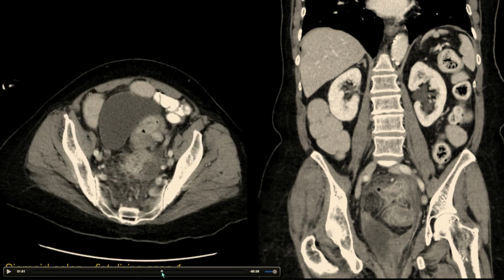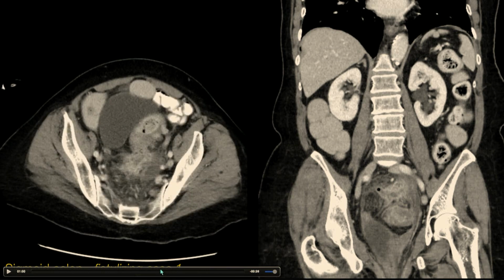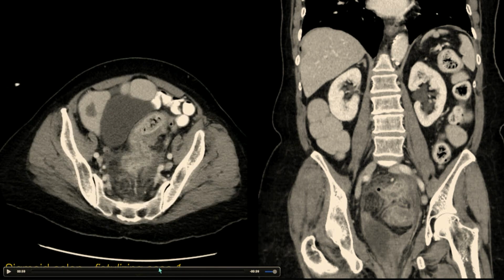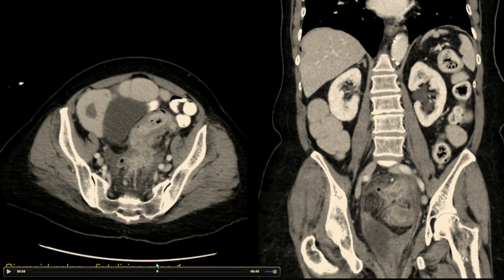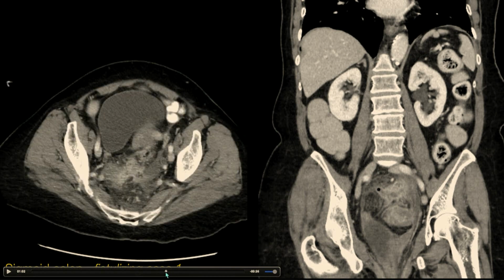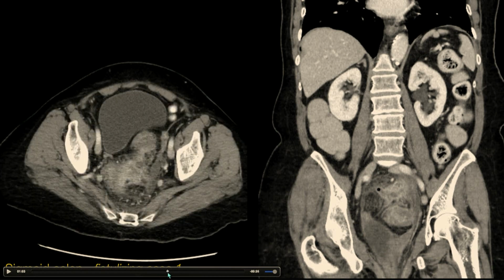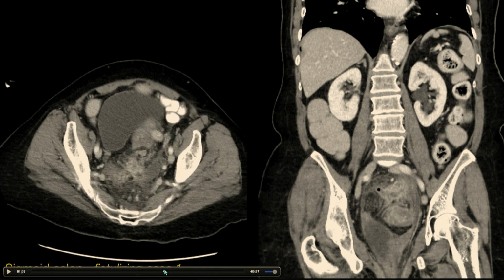You're seeing these extraluminal tracts communicating with the different bowel loops, maybe pulling on the small bowel or large bowel. So in this case, if you follow the lumen here and back up, and then you notice above it is the fistulous tract, there's actually a colocolonic fistula. So this is like a complex, arborizing, inflammatory colocolonic fistula. So chronic fistulizing diverticulitis.